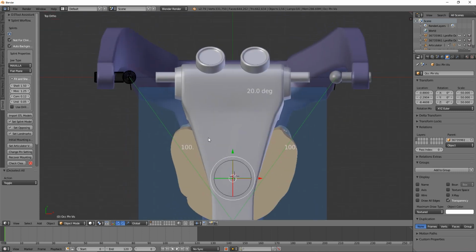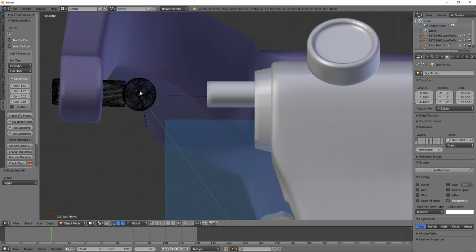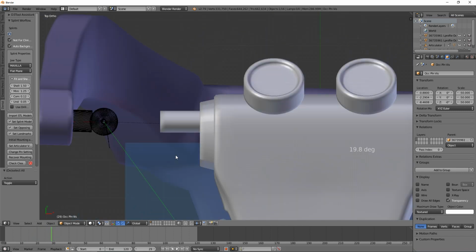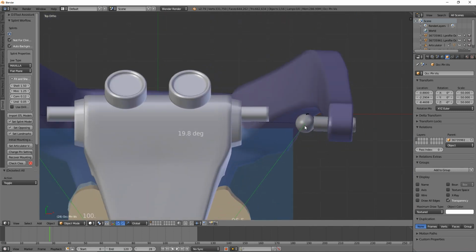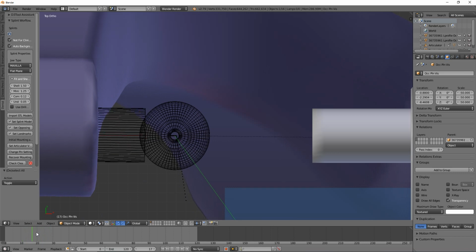If we look at this from above, when we are doing a right working movement, as I said before, if this is translating down a kind of straight path, the distance between the condyles should be maintained. So in the past, I was actually not letting the working condyle move at all, and then calculating rotation here. So that progressive side shift that should be happening as you slide down this track was not. And now if we look closely, we can see that it is. It's very subtle because at very small angles, this straight line is a pretty good approximation of an arc. But now we are calculating that side shift that's happening.